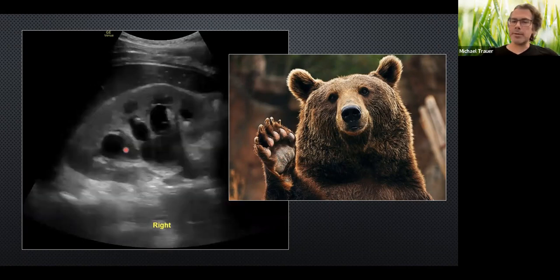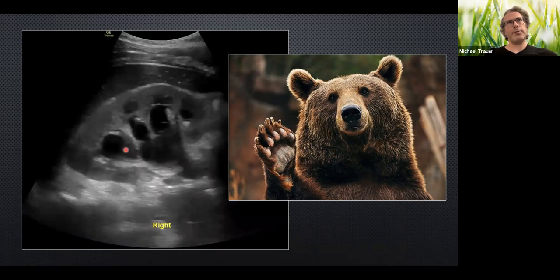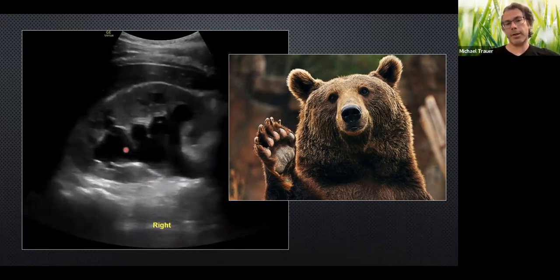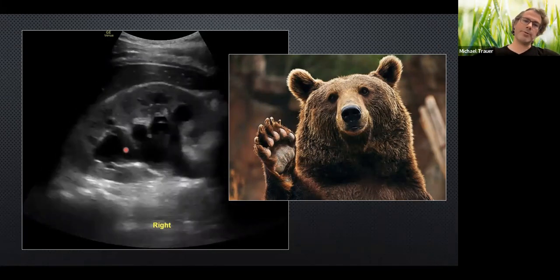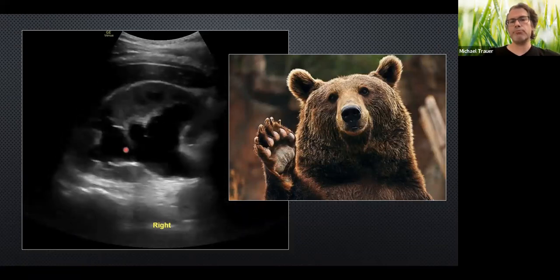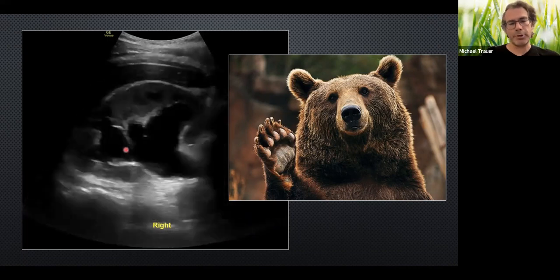mild hydronephrosis can sometimes just be because someone's got a very full bladder or if they're pregnant. So if you see some mild hydronephrosis, it's worth having the patient have a wee and then scanning them again, and it might just go away. But if you're seeing moderate or severe hydronephrosis, if you see the calyces, then that is usually because there's a pathological issue like an obstruction.